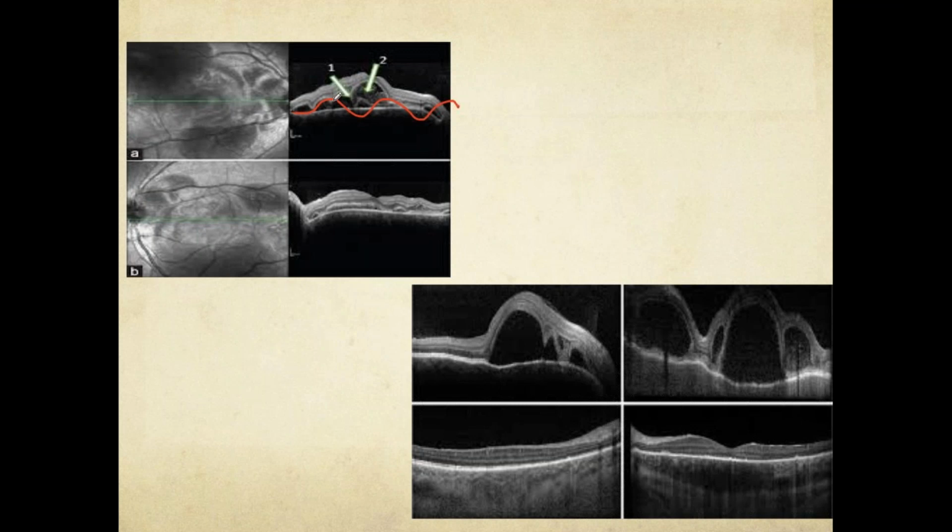But here, since this is flat, you see multiple PEDs, right? But you do not see anything here. If there was something like a hyperreflective material, you could say it was an ARMD, but this is flat, multiple PED, hypertensive, not controlled. I do not know whether you've heard of it or not. You've most probably heard of it. It's polypoidal choroidal vasculopathy. Have you all heard of it? PCV.